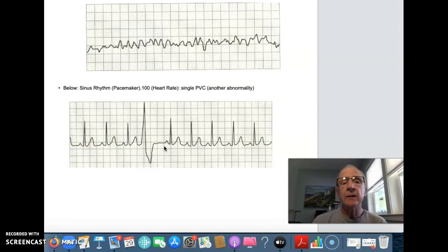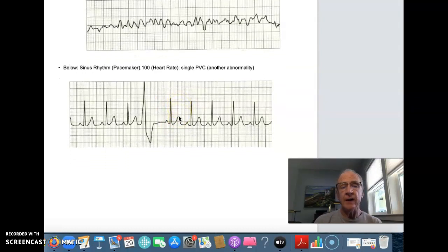As with all the dysrhythmias, you can have the dominant pacemaker in the ventricle, or you can have another dominant pacemaker, say a sinus or SA node, and have a ventricular dysrhythmia within that dominant pattern. So we have here an example of a good question that you will probably see in the quiz, and you will handle it the same way you've handled them all.